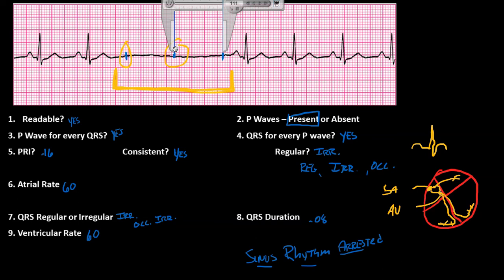And by the way, you may not pick this up on a pulse ox. You may also, though, pick it up on a pulse ox. Potentially, if there is a pause, you may notice that there is a change in the pleth wave. So if it's not producing a pulse with this, you may notice that there is a change in the pleth wave. And you can see that there's no electrical activity that's actually occurring in here, which could be a reason why that person has actually had a syncopal episode. Another good reason to consider that we like to treat people where they are from an EMS standpoint. That is absolutely true, that we want to treat them right where they're at. So we have to be able to put the ECG on them and find out early on whether or not there's any problem.